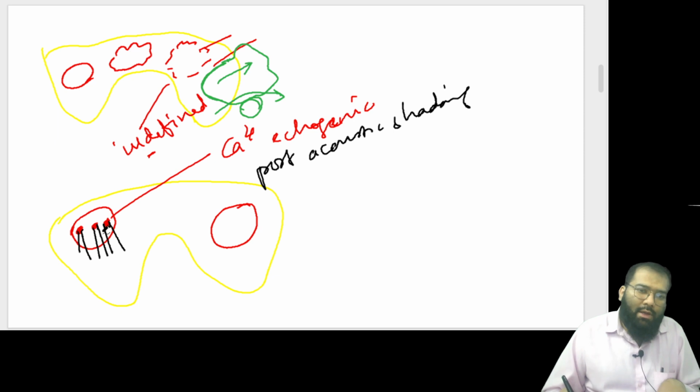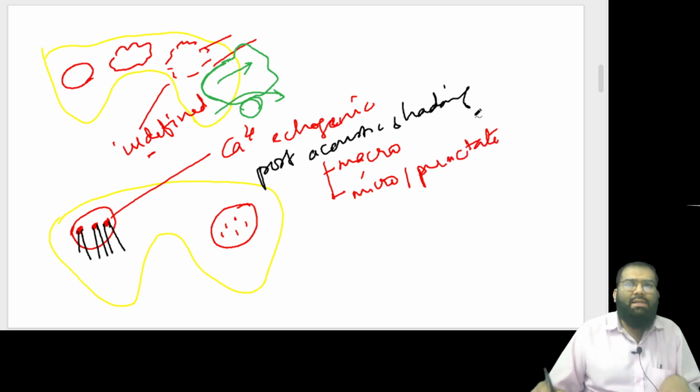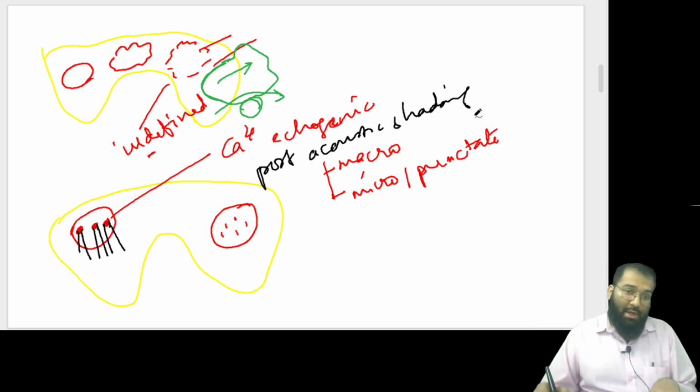a lesion. Now these are large calcifications. So large calcifications are called macro calcifications. But sometimes the lesion might have very small punctate calcifications. Sometimes a lesion might have micro or punctate calcifications. Punctate calcifications, not necessarily they would give shadows. So these are micro calcifications.